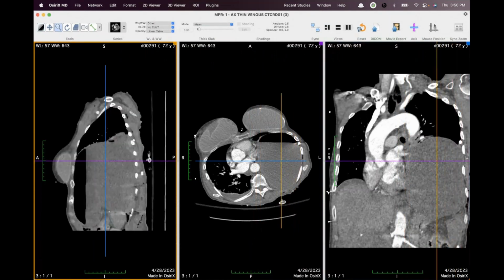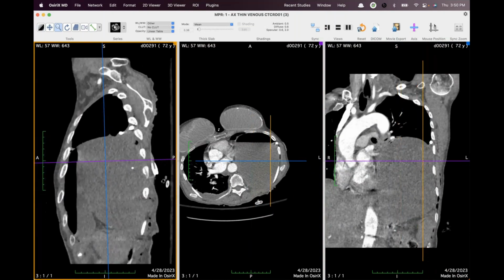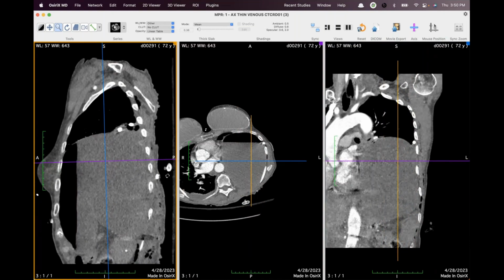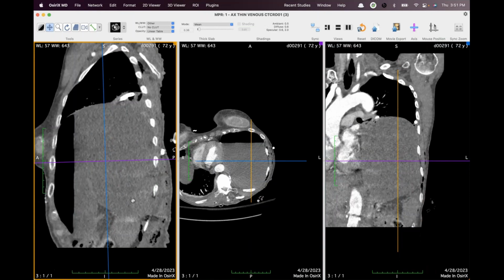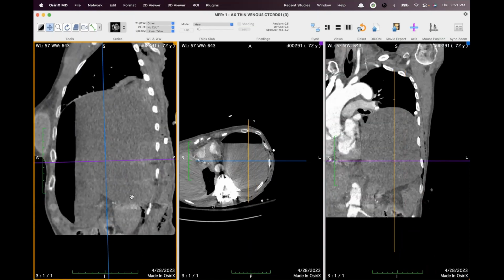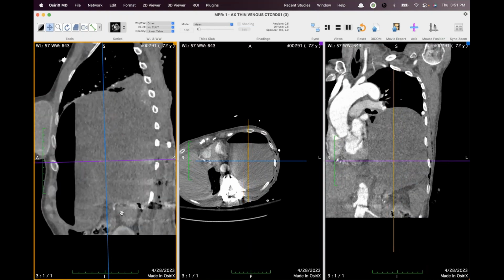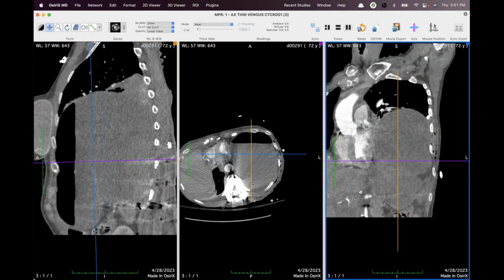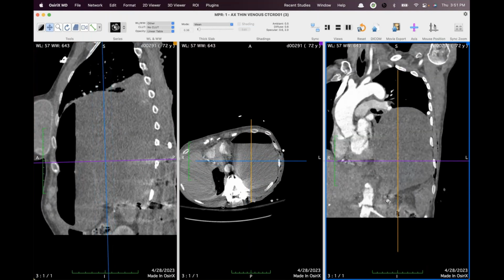It's just so hard to tell. It really is. These things are really hard to figure out. It seems to me that it's trying to form a waist down there where you get near the descending aorta, medial right there. I think it's the collar sign. Yep, there's a defect there, probably.